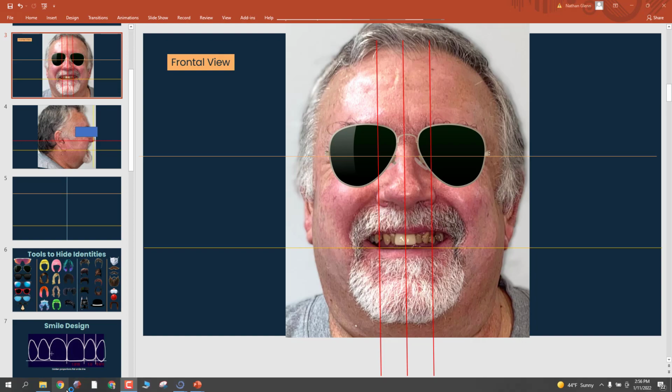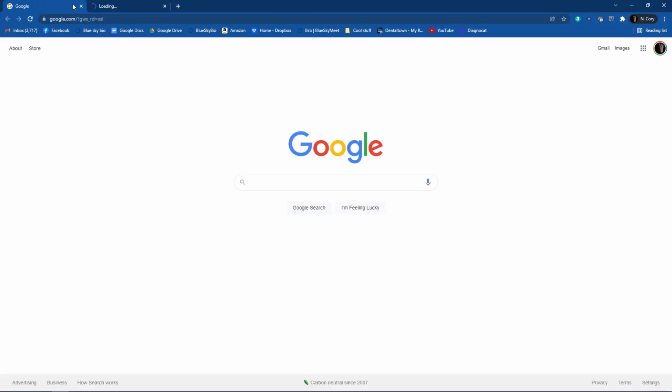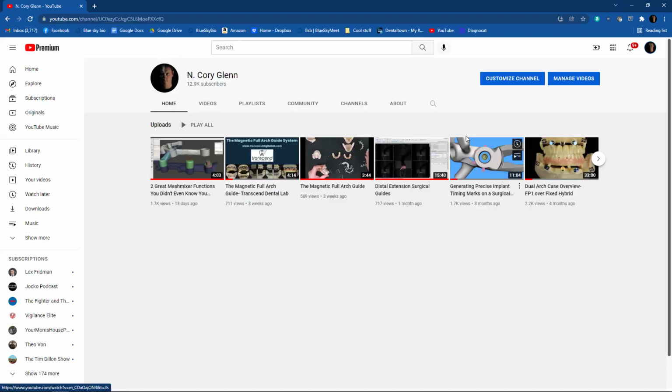I was going to do a video today on how I do the smile design and then turn that into the 3D wax-up for a full arch case that was submitted to us. To start out, when I do these, I start with the smile simulation, because if you've got a good simulation, you can know a lot more about where you need to virtually position the teeth for the wax-up.